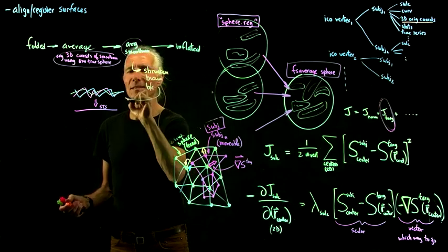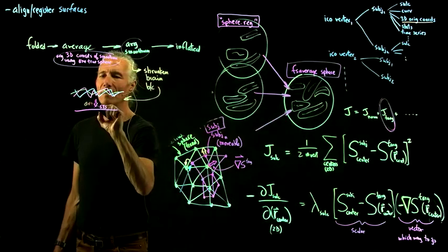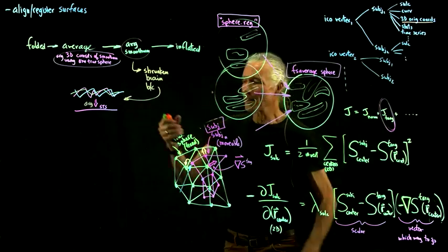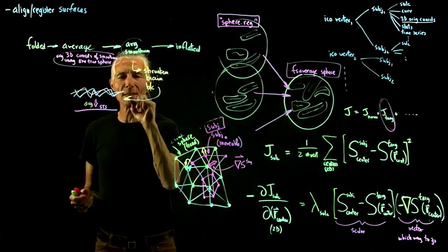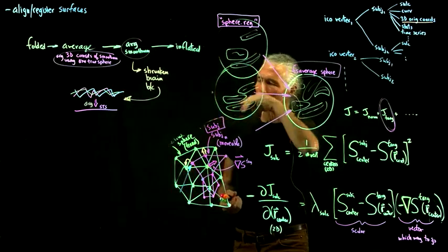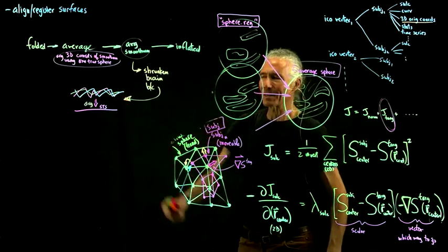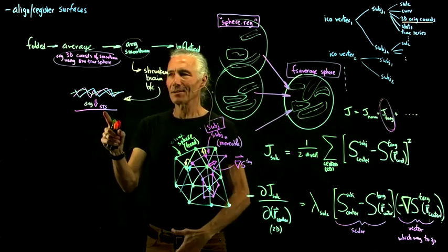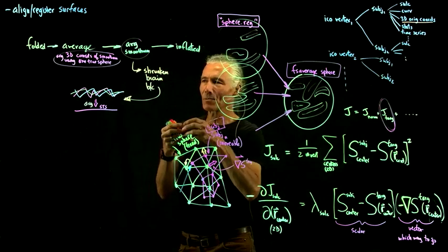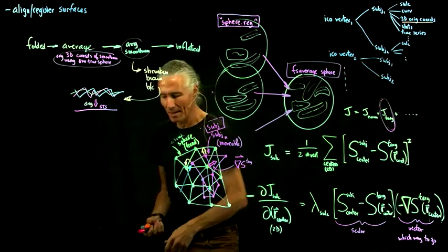When you average out all the little sulcal crinkles, you lose surface area in the sulci, and it's also not good because you're losing surface area selectively in the sulci, not in the gyri, because the gyri aren't as crinkled. So it's a shrunken brain, with selective loss of surface area in the average surface in the sulci. If you're trying to display data, that's not good, because it will slightly squish the activations in the sulci.